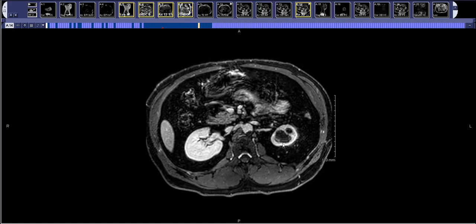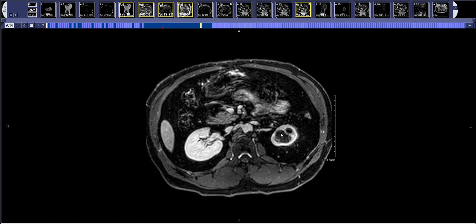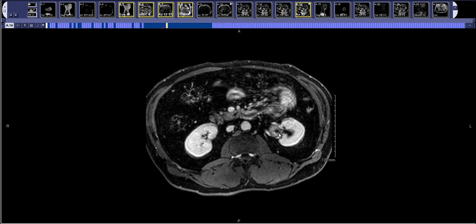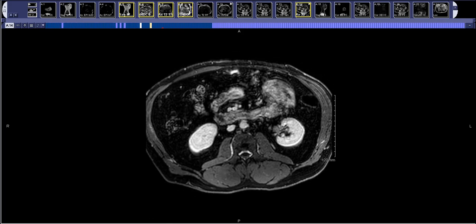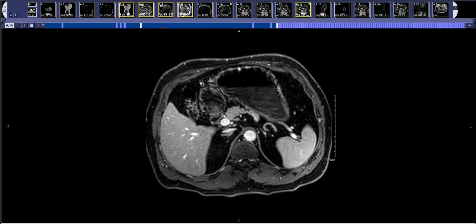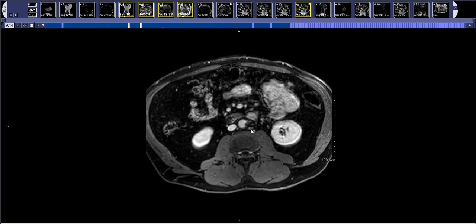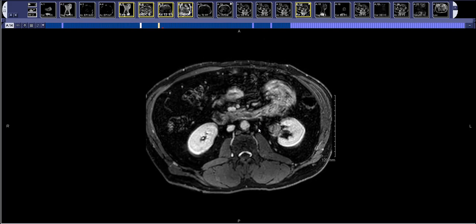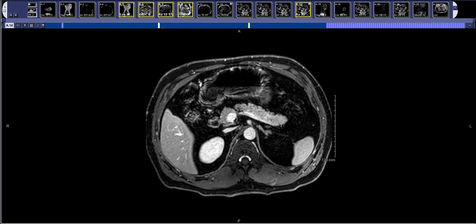Also more subtle is a delayed nephrogram within that thinned cortex of the superior pole, suggesting that there's some functional obstruction, clearly from this transitional cell carcinoma. Also important to assess for any regional or distant lymphadenopathy. We can see there are just small retroperitoneal lymph nodes in this patient, no other signs of abdominal adenopathy.